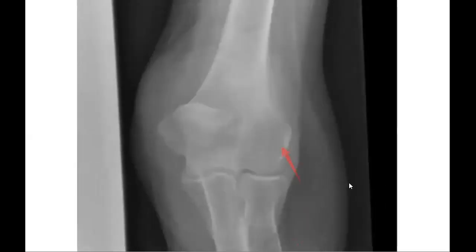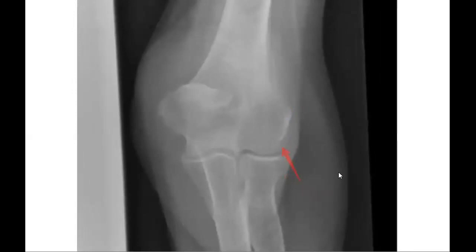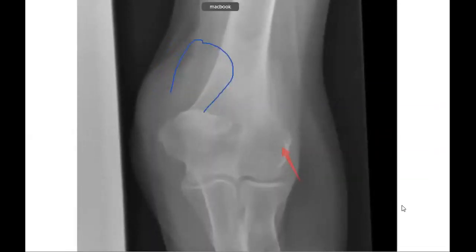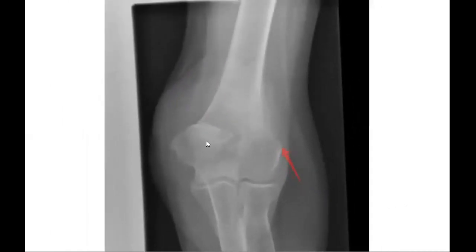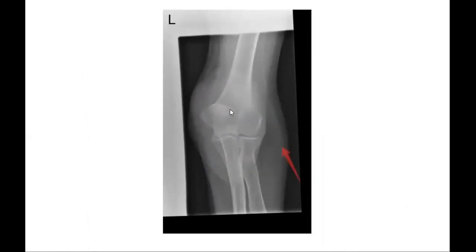The most common fractures here, you are searching for supracondylar or radial head, but it is not supracondylar. It is not. Yes, it is exactly in the olecranon process, olecranon fracture.